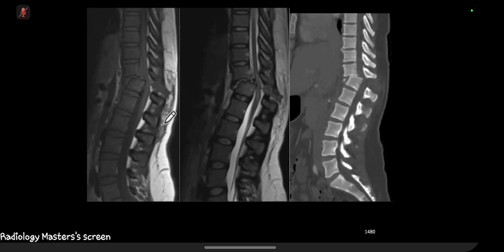That's very unstable because, of course, the anterior and posterior longitudinal ligaments have snapped in order to get that appearance. And it's called Chance fracture after an orthopedic surgeon called Chance, who first described this.